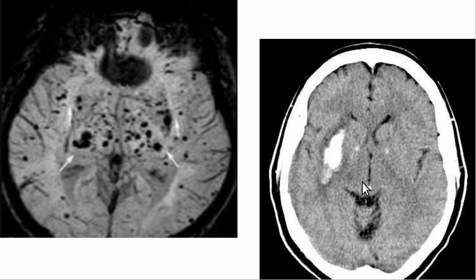And most of the time, big bleeds present more suddenly. This patient will have a dramatic neurologic deterioration. And so they'll just get a CAT scan. They'll even be too sick to go for an MRI a lot of times. And it's an obvious hemorrhage there. Okay, we'll sometimes check to see what's the cause of the hemorrhage. We'll try to figure that out. But the point I'm saying is big bleeds happen suddenly. Go to the CAT scan, and that's usually enough in that setting.